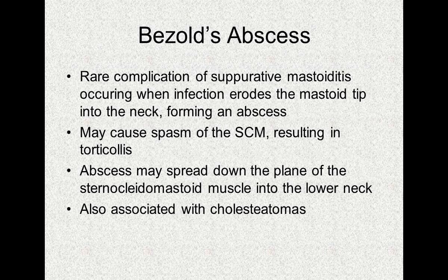Bezold abscess is a rare complication of suppurative mastoiditis when infection erodes the mastoid tip into the neck, forming an abscess. Because of spasm of the sternocleidomastoid, it results in torticollis. The abscess spreads down the sternocleidomastoid into the lower neck, sometimes associated with cholesteatoma.